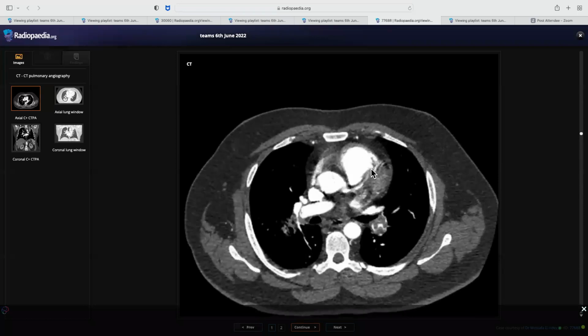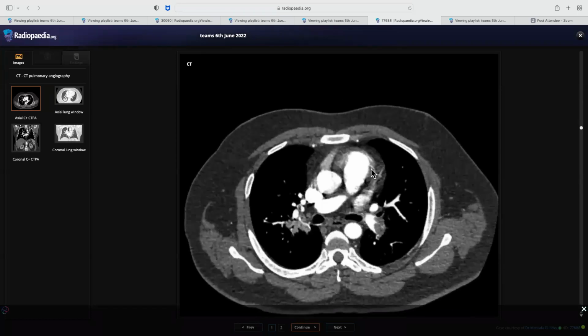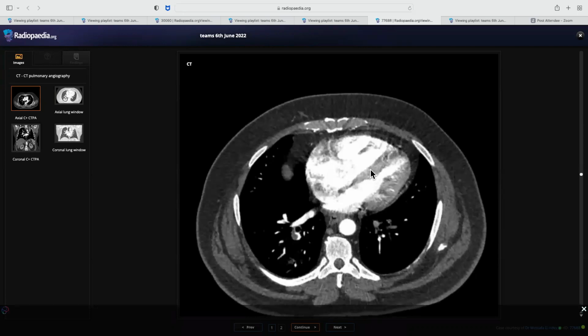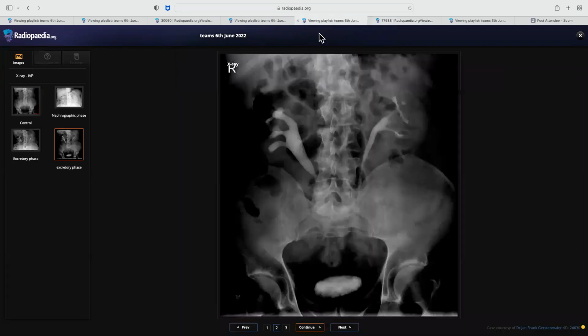And then you can further comment that if it is even more severe, there is paradoxical bowing and the right pulmonary trunk is enlarged. And of course, you said about the IVC contrast reflux. And then risk factors also you mentioned, that hypercoagulable states we will look for. All that was very good.